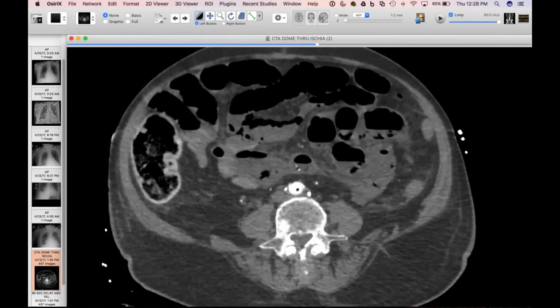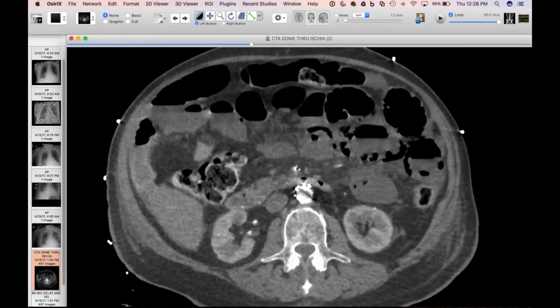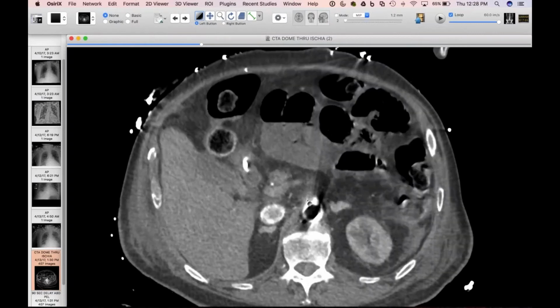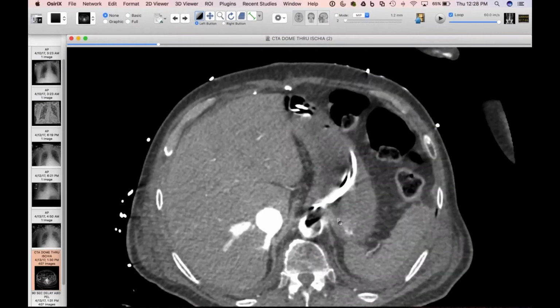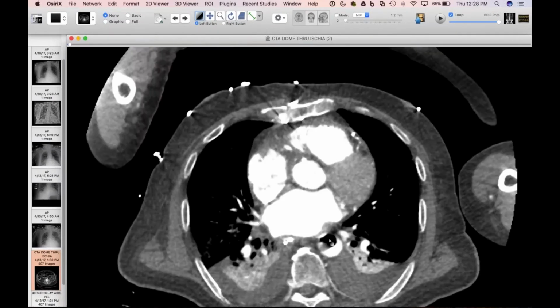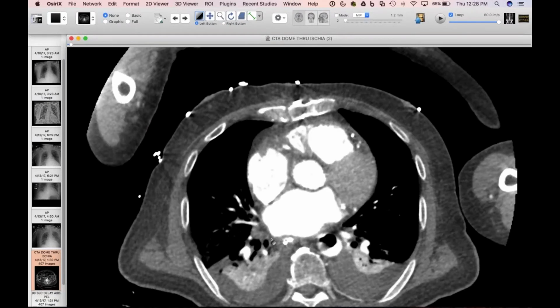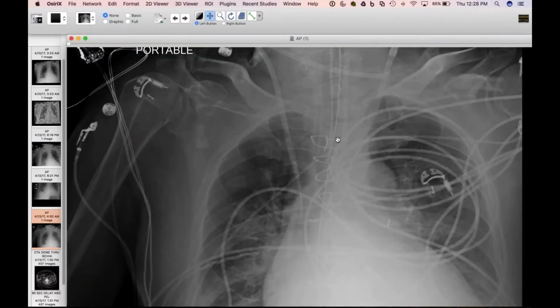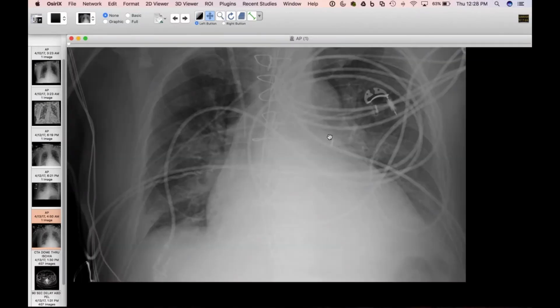It was just the first example I've seen where it's really that low, or where it's actually had consequences, because I know we talk about the ideal position and how if you have it too low, it can cause these issues. Unfortunately, I don't know on this study how far up it actually goes, because this was just an abdomen and pelvis CT. But just a reminder, and we've actually seen a couple of new balloon pumps that are more visible than this. Clearly, they did not consult a radiologist when they designed these things, as we all know. But this was one that had snuck down too far and was contributing to his mesenteric ischemia.